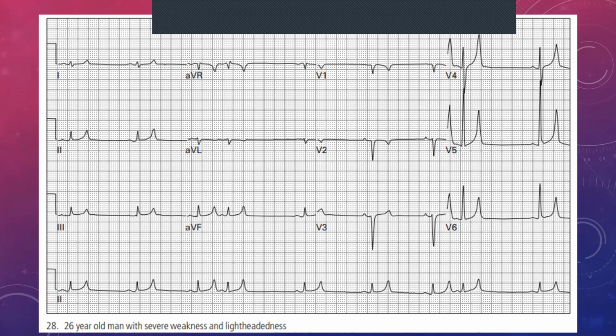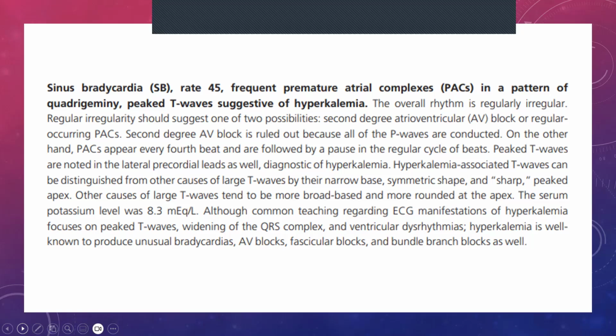So if this patient was with you, you'd, for instance, take, let's say, a blood gas that could quickly show you your electrolytes, and you would, of course, take your cardiac enzymes that would also possibly show you if there was any ischemia. So we're just going to move on from this a little bit, and we're just going to have a look at the answer.